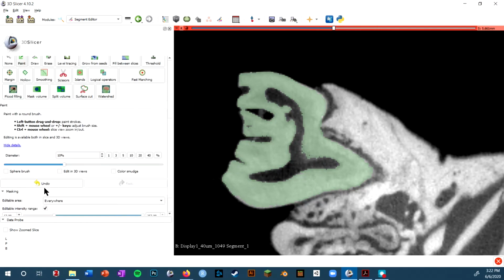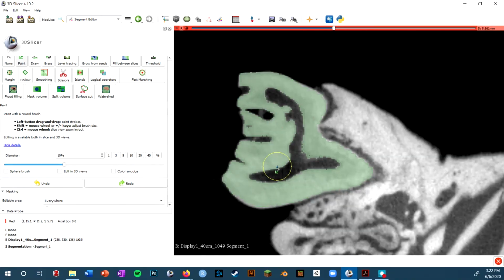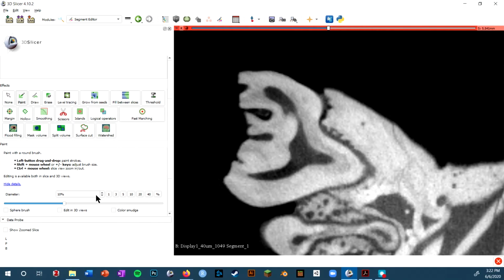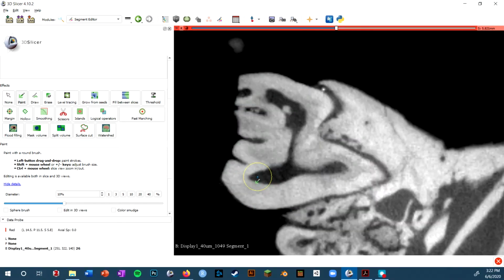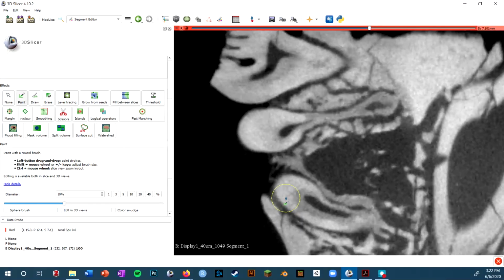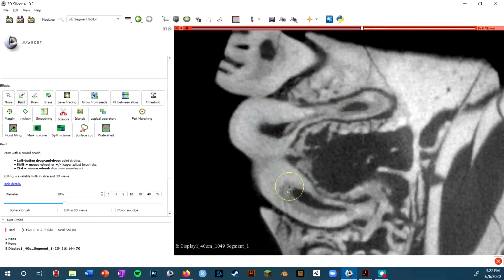And aside, this is the only time you can undo things in Slicer. Okay, so, I've painted some of these slices, but it is still going to be time consuming to go through and paint all of them. However, the Segment Editor Extra Effects extension actually adds this really neat tool called Fill Between Slices. So you'll see I've already gone through and painted a bunch of the slices about every 5 to 10.